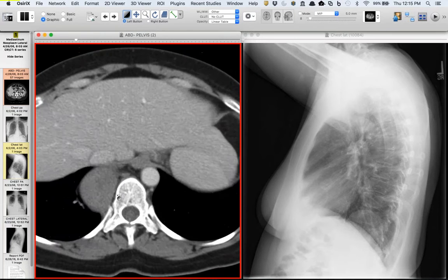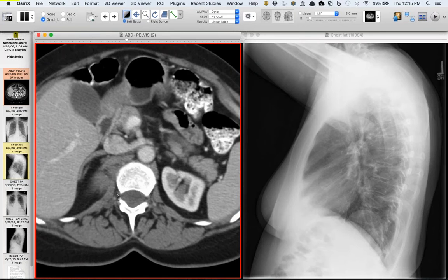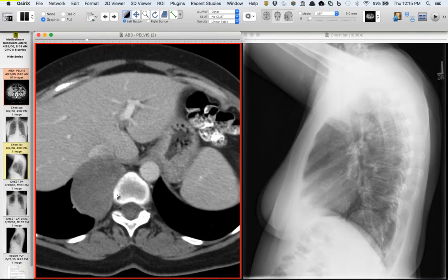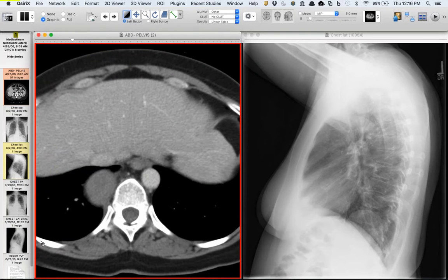Because I started to think of a neurogenic tumor and wondered whether it was going up from the abdomen into the chest, having arisen below the chest. Let's see. Yeah. I would think of a neural tumor or an extralobar sequestration. Yeah. The sequestration is a good thought too.